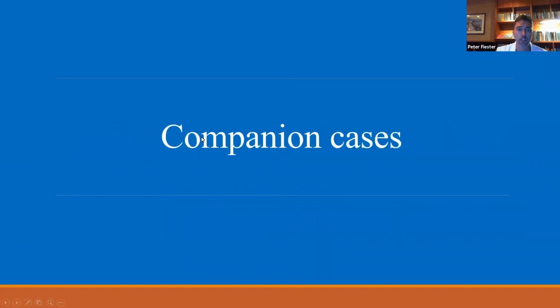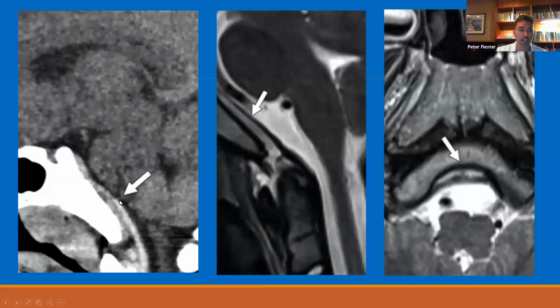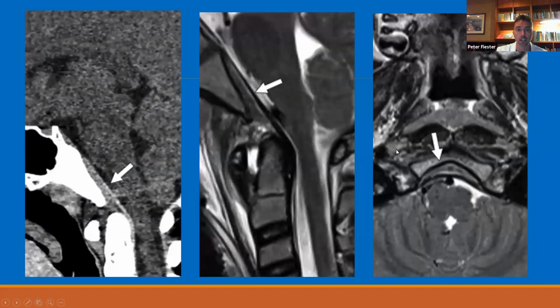We did a study on these patients, and we have a bunch of cases, and this is again the tectorial membrane being stripped off. Half of the patients had major craniocervical ligaments, like down here you can see that they have additional craniocervical ligament tears, and the other half had this as an isolated finding. But the hematoma never got bigger in size, and I think most patients were treated conservatively and did okay. And this was another case. So the key is to recognize this on a CT exam. And if you see a hematoma in this compartment in a child, you need to do a follow-up cervical MRI to look at the ligaments.